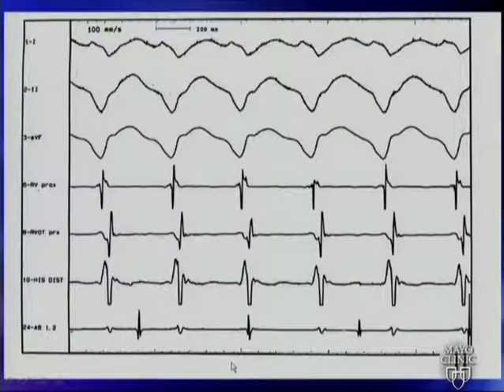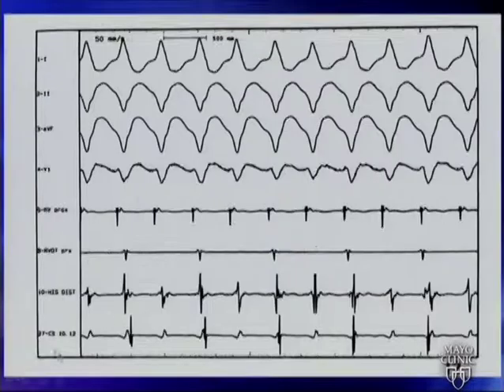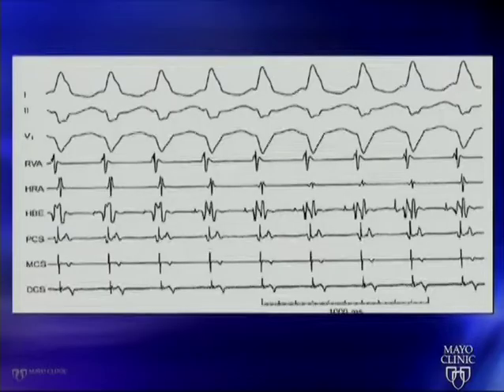Sometimes instead of an atrial catheter, there will be an ablation catheter or a catheter in the coronary sinus, which records atrial electrograms. And what you can recognize is, look at these atrial electrograms. There are so few of them, but ventricular electrograms are numerous. So same diagnosis, more V's than A's, ventricular tachycardia.